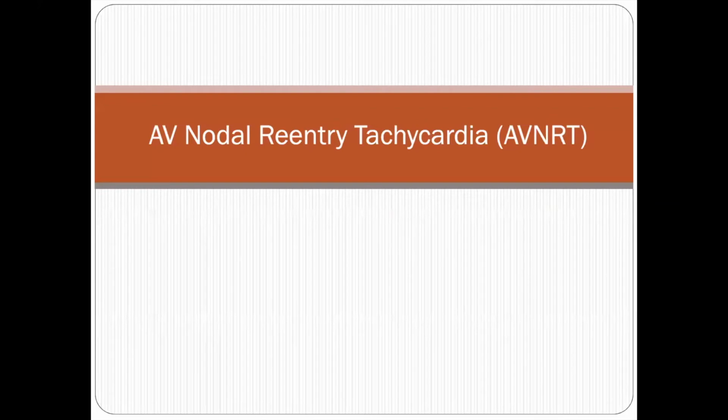Okay, so again, in terms of definitions, a junctional rhythm traveling 40 to 60 beats per minute is what we call a junctional rhythm. One that's traveling 60 to 100, we call accelerated. Then we have some definitions. If it's between 100 and 130, we would refer to it as junctional tachycardia. If it's over 140, then we will likely be calling it AV nodal reentry tachycardia, AVNRT.